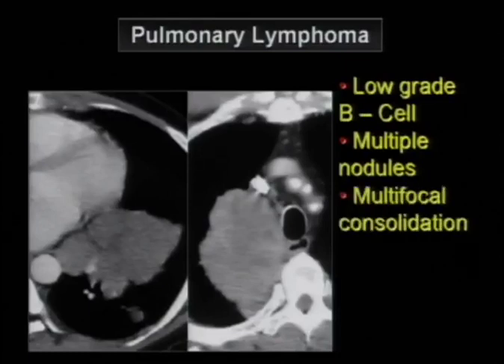Multifocal consolidation-like appearance, much like this case here on your left. It superficially looks like consolidation, until you look closer, you see there's no bronchogram in there. And that's not uncommon with lymphoma, that there's no bronchogram within the lesion. I wouldn't say it's diagnostically specific, but when you see mass-like areas of consolidation, lymphoma is something you want to think about. Or it can present as a solitary nodular mass. Those are probably the 3 biggest presentations.